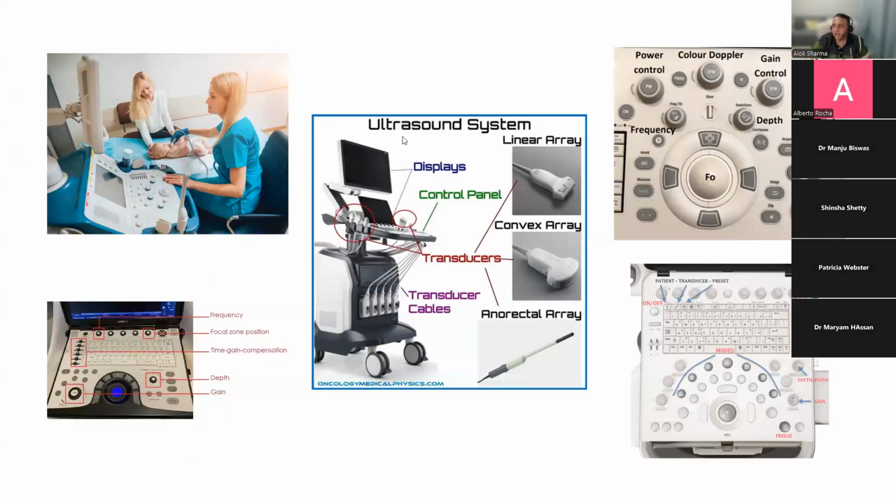But for the parts of the ultrasound machine, you have certain buttons. Now, the first step usually when you're using your ultrasound machine is turning the buttons on and off. That, I would say, is something that, if you're using a new machine and have never used it before, can actually be quite confusing. But most machines will give you an on and off button.